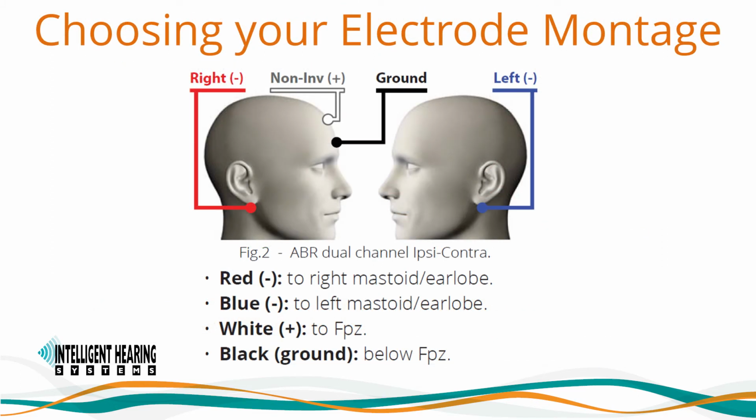Some clinicians choose to acquire an ABR immediately following an eCoG, or an ABR and eCoG at the same time using two different acquisition channels on a two-channel system. For example, channel A may be set up with filters to acquire an eCoG, while channel B is set up with filters to acquire an ABR, or vice versa. Both channels are designated as on in these cases.